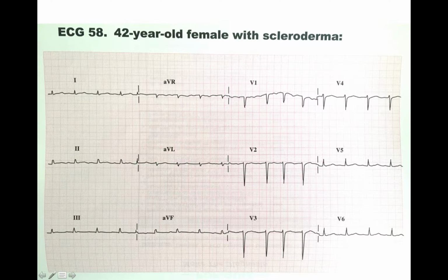So in this patient, as we mentioned in the pericarditis video, you're worried about the pericardial effusion. So pericardial effusion is often fluid around the heart, which results in the low QRS voltage because the heart swings back and forth in this pericardial fluid during the cardiac cycle.